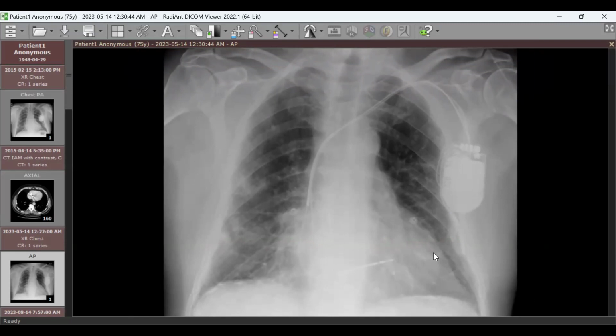Okay. Some sort of cardiomegaly, mild cardiomegaly. And also there are some calcified plaques right in the diaphragm, pleural base. Yes, with mild cardiomegaly. Okay, I'll show you the older chest X-ray.